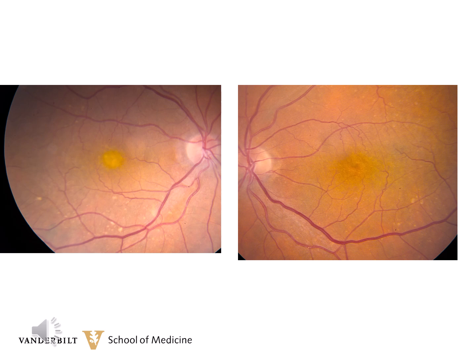Here's a 79-year-old male who 7 years previously had vision of 20/20 in both eyes. He's now 20/30 in the right and 20/40 in the left. You can easily see the vitelliform lesion in the right eye and some drusen in both eyes. The yellow lesion in the left eye is there, but it is not as well defined and noticeable. So the question is, is this age-related degeneration or is it pattern dystrophy? There are pigment mottling, pigmentary changes, and drusen.